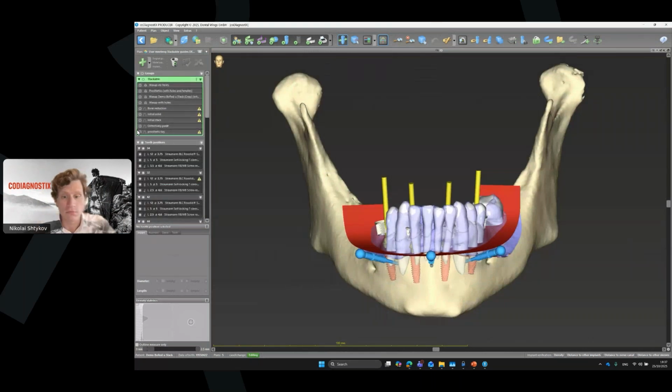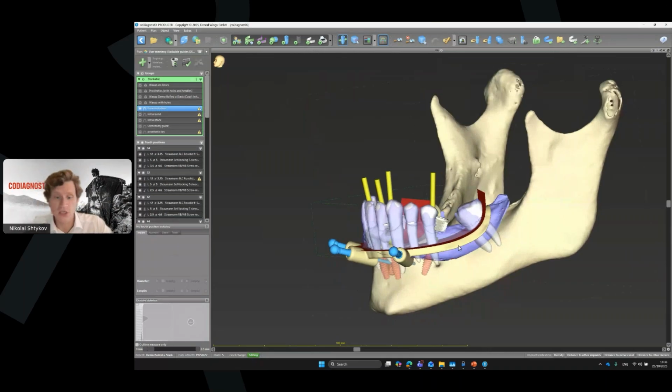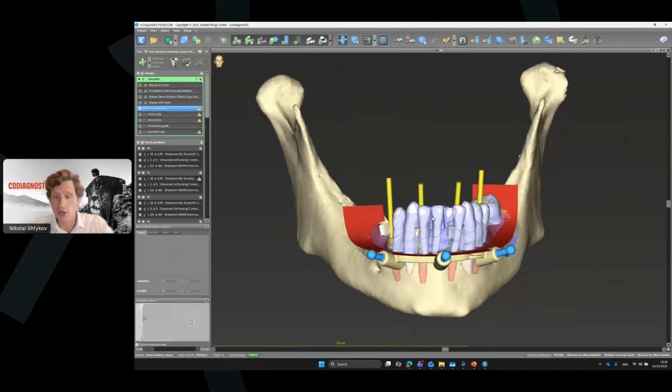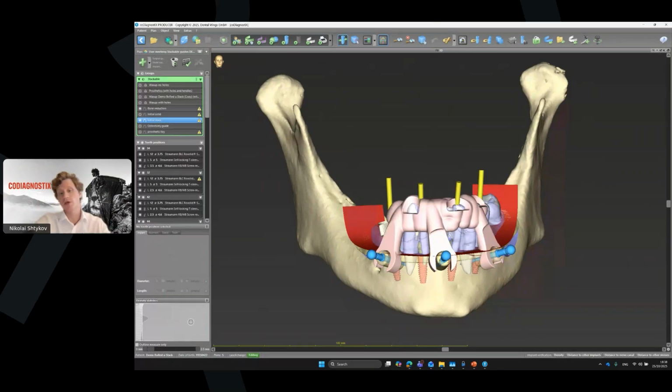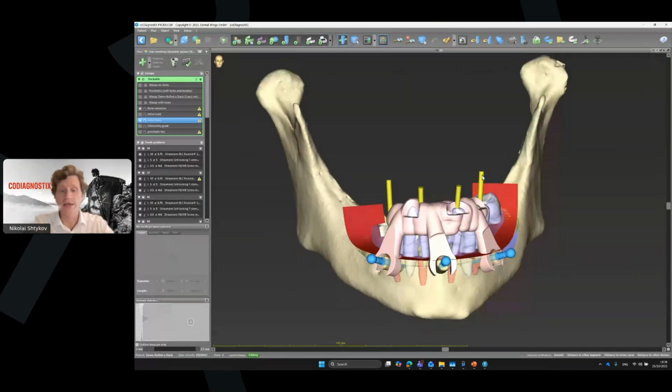And so if you create just a frame as a bone reduction, you see that this tooth is in the way of this frame. And actually, the front teeth are enough to make the initial surgical guide, so we can do this in a different way. We can create this initial guide as stackable with the frame. Maybe I can do this in 2 steps.